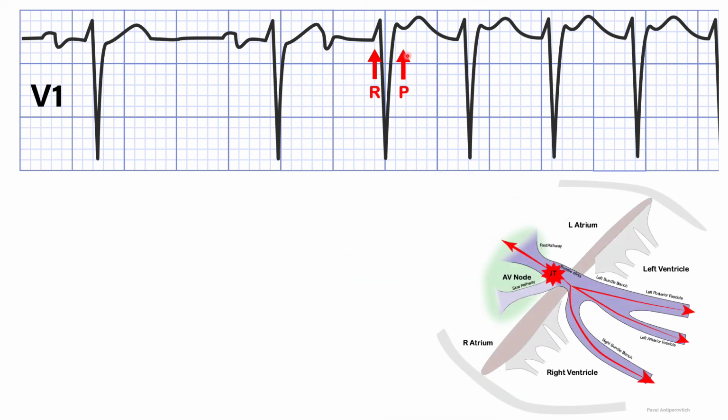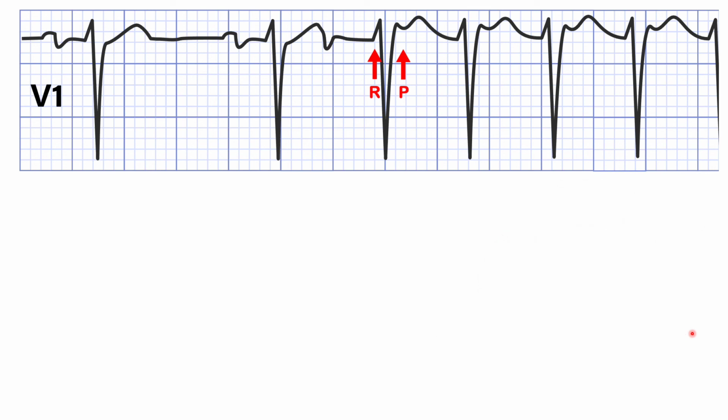And finally, in the case of JT, with each JT cycle, there is also a pseudo VA interval where the fibers that lead to the atrium and the fibers that lead to the ventricle are engaged at the same time. So it is very likely that this could very well be JT. Typical AV-NRT is far more likely and more common than JT, so it's still higher on the differential diagnosis compared to JT.